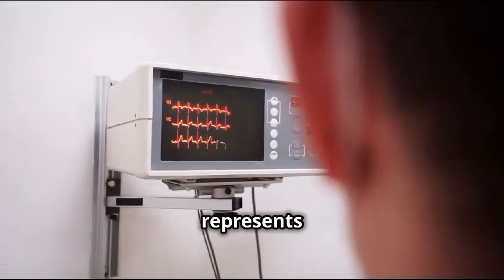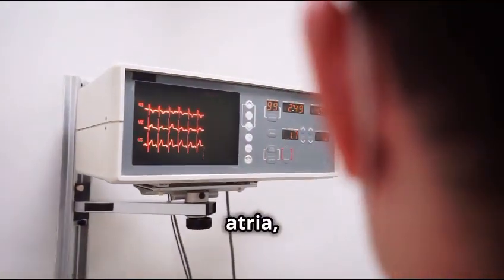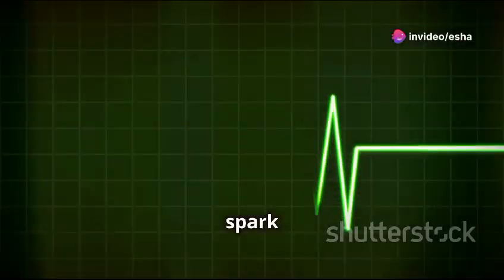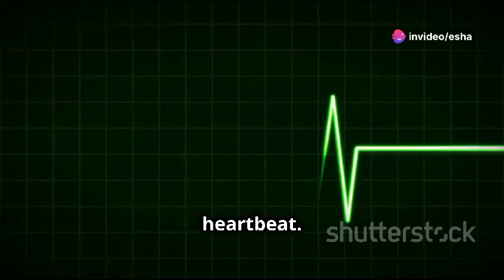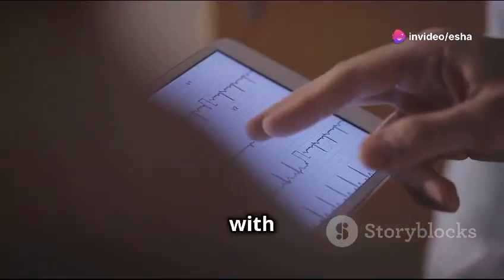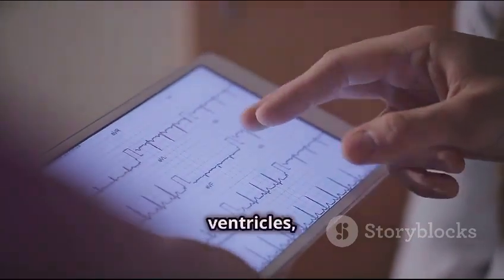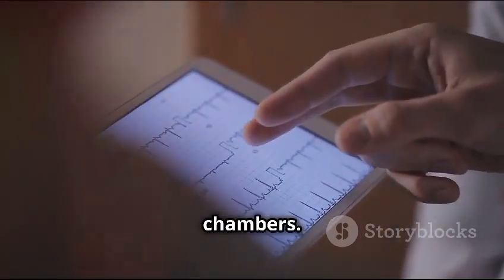The P wave represents the electrical activation of the atria, the heart's upper chambers. Think of it as the spark that initiates the heartbeat. The QRS complex, with its characteristic spike, corresponds to the depolarization of the ventricles, the heart's lower chambers.